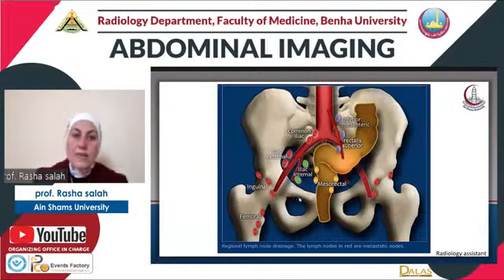Let's see what the metastatic lymph nodes are. When we see a lymph node in rectal cancer that is not a regional lymph node, this is a metastatic lymph node. The common iliac lymph nodes, external iliac lymph nodes, and inguinal lymph nodes are metastatic lymph nodes.